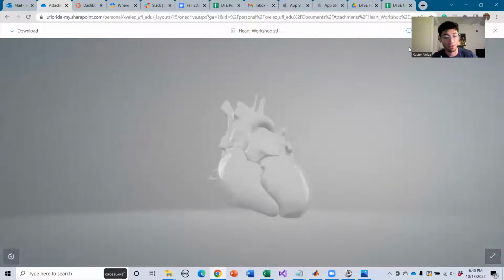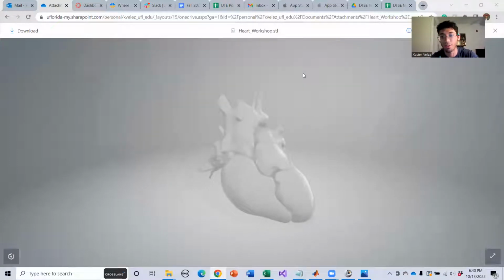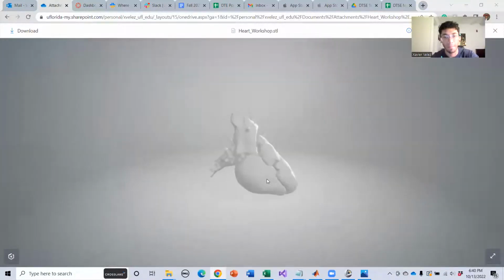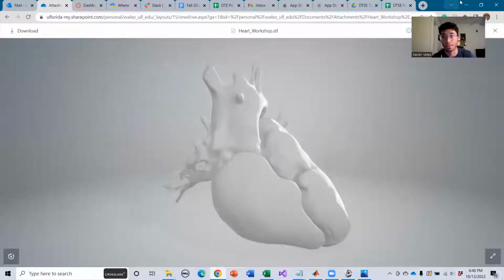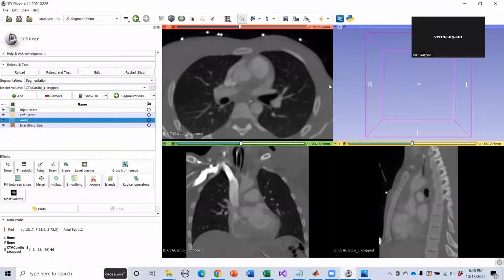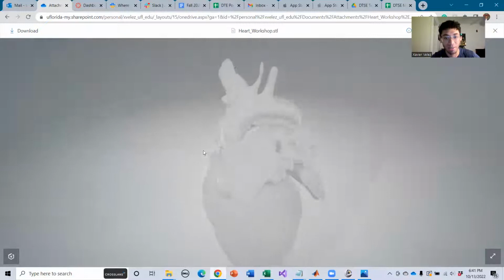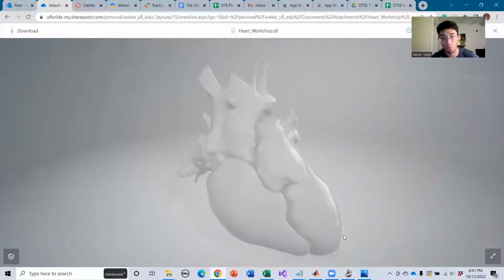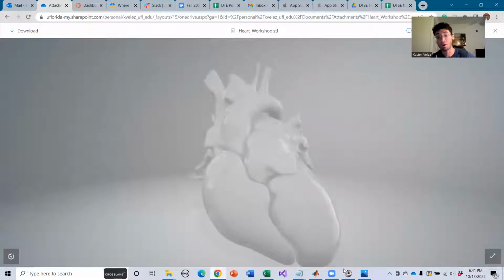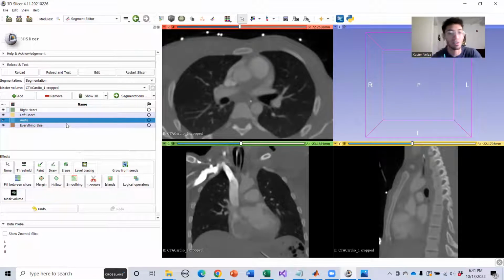And especially if there's anyone from the cardiology team, I'm not sure if there is, maybe, I don't know. If there is anyone from the cardiology team here, you will need to segment the aorta separately because it's right here. Yeah, oh sweet, what's up? Nice, heck yeah. The LVAD implant goes from the left ventricle to the aorta. So those will probably be the most important parts to have segmented cleanly, I guess.